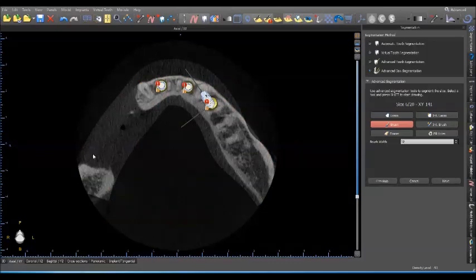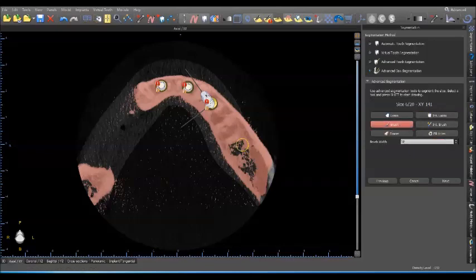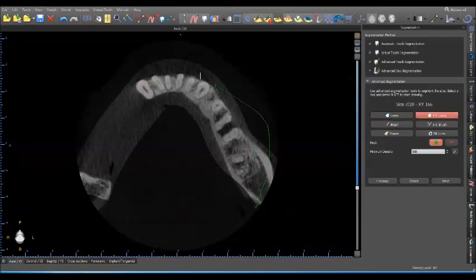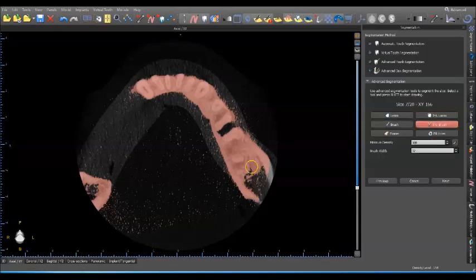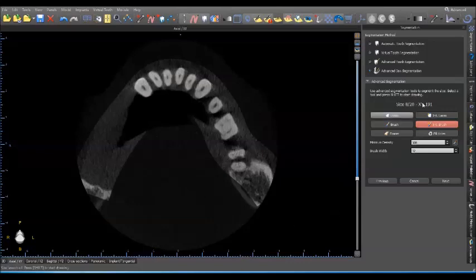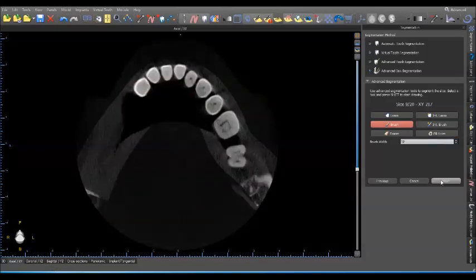So I guess this is the lower mandible that has atrophy. So fill holes. Everything's going well. Brush, shift key. Fill this in. Next, Intelligent Lasso, shift. I'm going to fill holes. Let's see. Brush, shift, fill this in. Let's see. Next. I'm not really concerned about this, but I'll just do it anyway. These are teeth. I'm going to wind up cutting these out in the plane cut tool. You'll see that in a little bit. I'm using my brush. Try to fill this in. Next. Not really worried about that.